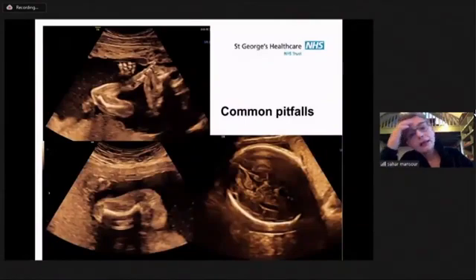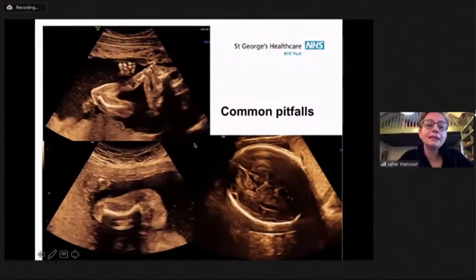So I hear that I'm not alone in making this mistake. This is a fetus, and it looks very much as though there are fractures of long bones, normal mineralization of the skull, and curvature of the long bones. This is a couple. I told them that the baby very highly likely had osteogenesis imperfecta type 3. It wasn't the lethal form.